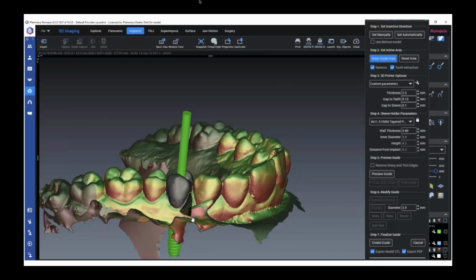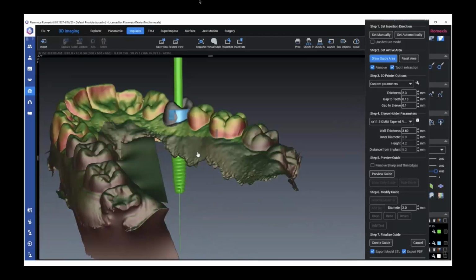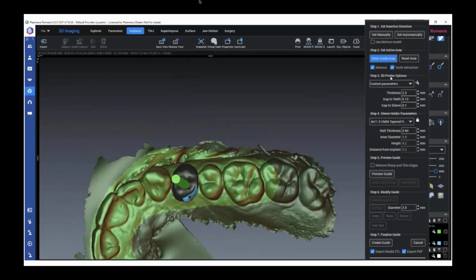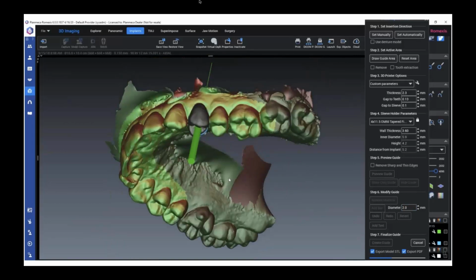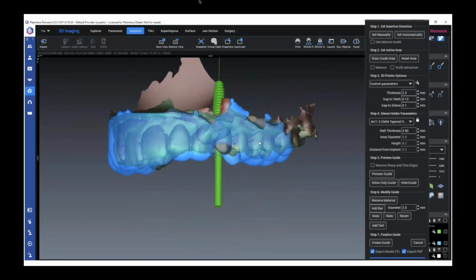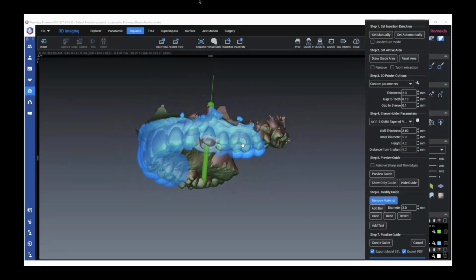You don't necessarily have to eliminate the entire contact of the tooth you're digitally extracting, especially if your sleeve doesn't really extend all the way to the contact point when you do this. So here we go. We are going to tell the computer to go ahead and create a proposal, and then we'll erase that and customize it so that we're happy with it. And once we do, then we'll just process the guide just like we did on the other case. So there you go. It's eliminating that tooth, and it's embedding the surgical guide directly into the space, and I'll skip the rest of this.